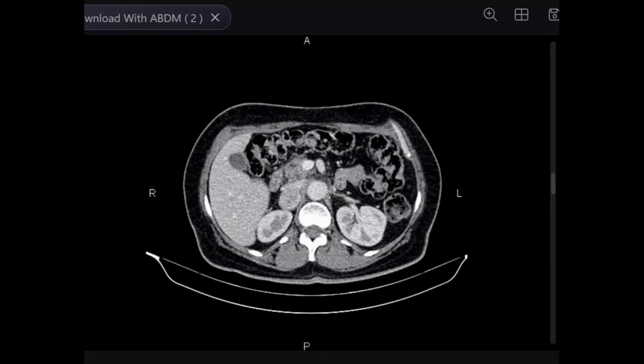Okay, but you did very, very well. First, you should think of metastatic lymphadenopathy. You should think of any retroperitoneal neoplastic masses, sarcomas, but it doesn't look like sarcoma. Maybe neurogenic tumors. We have different types of neurogenic tumors. One of the differential diagnoses for neurogenic tumors is paraganglioma, as you can see in this case. Thank you so much, candidate number.